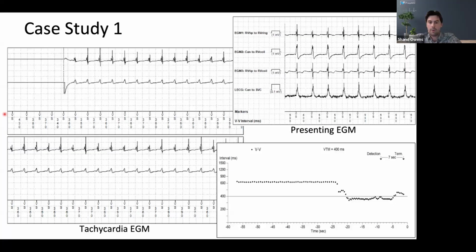Usually with these single chamber ICDs, there are not a lot of pacing indications in some of these patients. So there's generally going to be a V-sensing presenting EGM that you can take a look at and compare to a tachycardia in question. So if we look at this tachycardia EGM, we take a step back, it's regular.